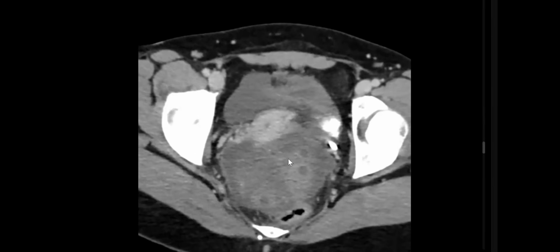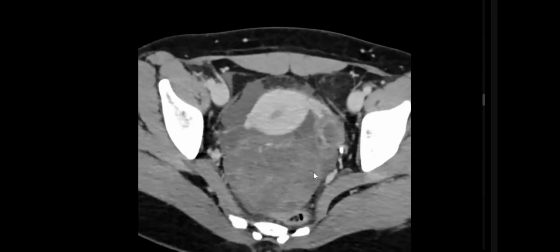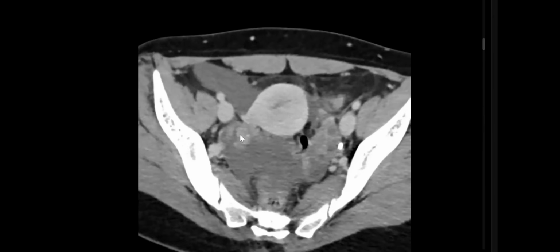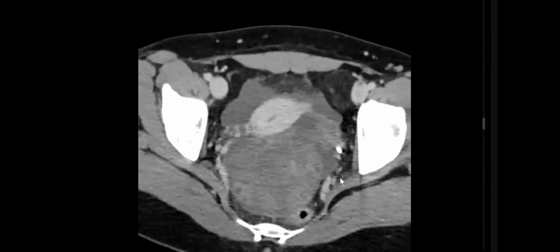No, it contains small cysts. Small cysts at the periphery means displaced follicles at the periphery. This is a picture of ovarian torsion. And I cannot see the broad ligament well on the right side. Here, we can suspect some swirling movement. And if this is the ovary, it's enlarged.